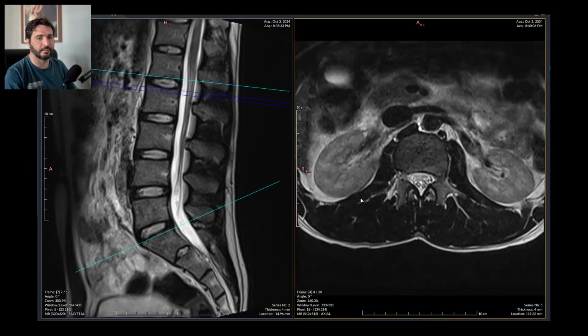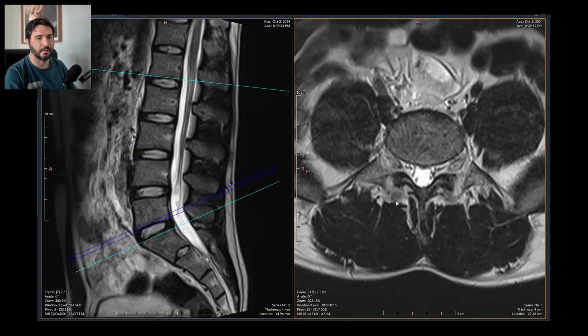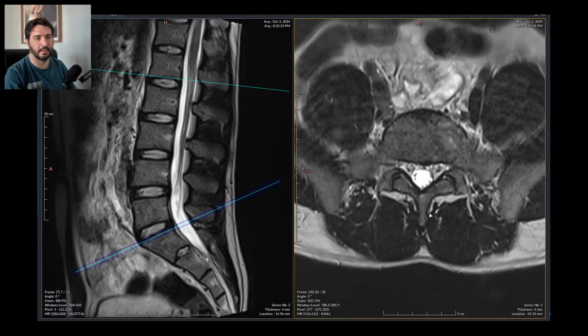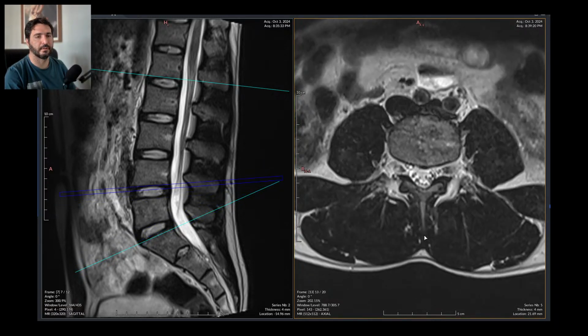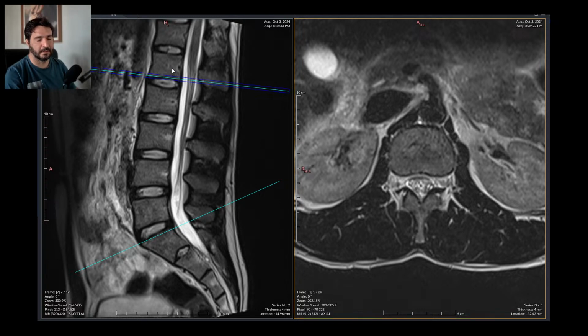Let's see in axial view to look for thickening of the yellow ligaments and hypertrophy, arthrosis of facet joints. I see some accumulation of fluid on this joint right there, and of course the technician decided the lumbar spine should end right there and not right here, so he made a half scan of this segment. Why not? It's okay to scan D12 L1. Is it D12 L1? It's 1, 2, 3, 4. Oh, he missed 1, 2, 3, 4, 5. He started too low and ended too soon.